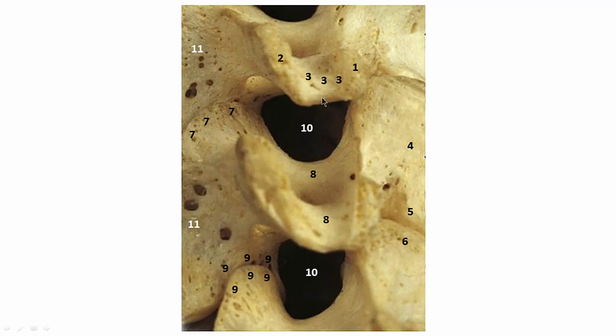Yeah, again, it's kind of hard to see, but there's the transverse foramen right in the center, and this base right here, that's the neural groove, and the end part of it again is between the anterior and posterior tubercles. So that was called the what again? Intertubercular lamella of the transverse process is just here on the end. It's not back down here.